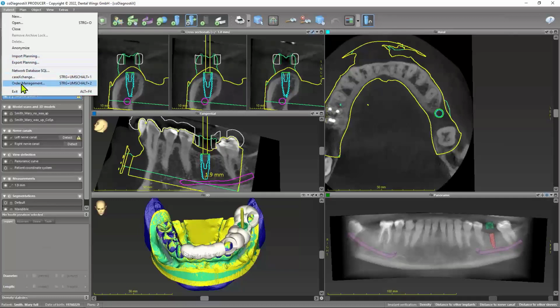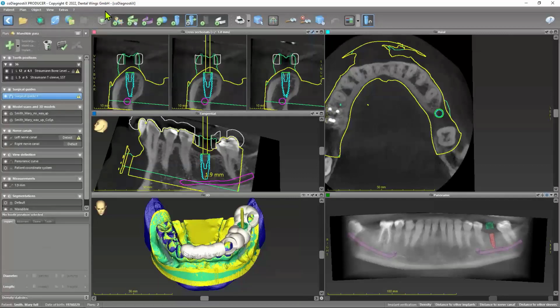And here we have additional functions for the advanced training, for if you have a SQL data set, if you are a reference lab, there are different things here. So now let's go on the left side.